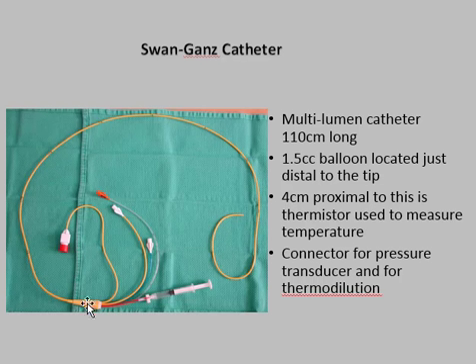That's what the Swan-Ganz catheter looks like. It's yellow in this case, as they're color-coded for their purpose. This one, you can see, has a sealed syringe that inflates that little tip. It's not inflated. And you have little ports where you can inject saline or take blood out, the samples, and connect to a cardiac output recording system.